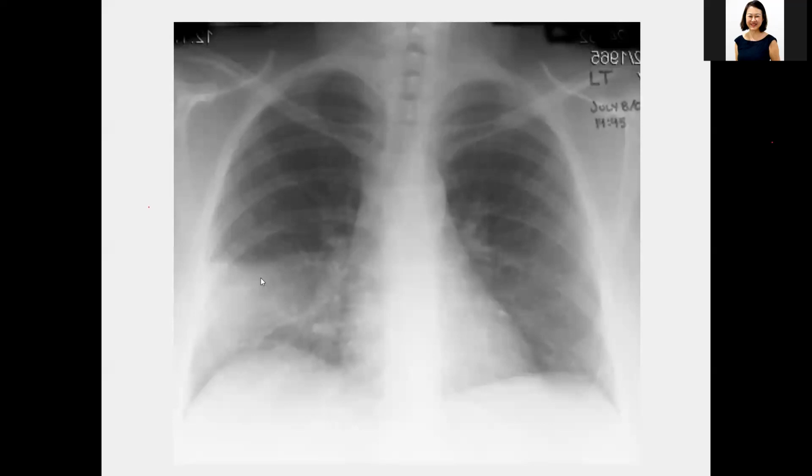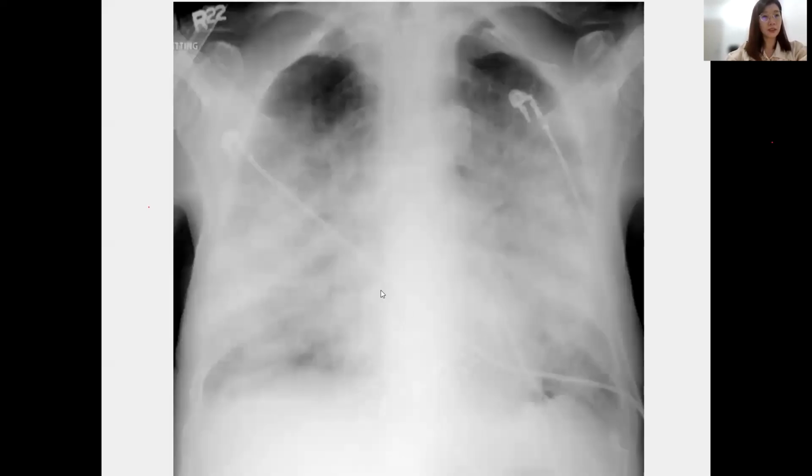So if you look at it clinically, I think you also have to think, oh, this is a lobar pneumonia, but I don't see anything over the right. Sorry, the left, I mean. Over the left, yeah, there's nothing on the left actually. Maybe the quality of this film is blurred. Okay, never mind. But when you say opacity, you will really look at this kind of whitish opacity rather than a vague one, there is or there is not. Okay, when there is, there is. Okay, these are bat wing.